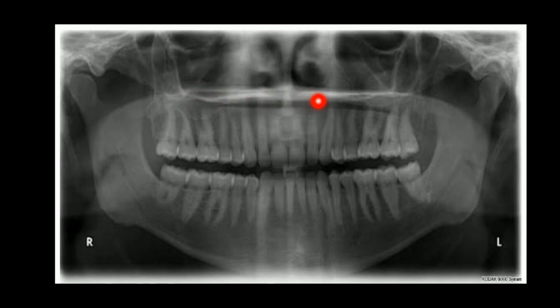Next you have this radiodense line present here, that is nothing but your hard palate. This is anterior nasal spine followed by the nasal septum. This is the nasal cavity, which is radiolucent, having the nasal conchae present between. The incisive canal and the foramen lies just between the two central incisors. And then we have here somewhere the hamulus present, and these are nothing but your dentition in your maxilla. So these are about your maxilla.